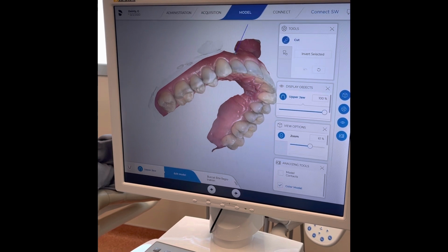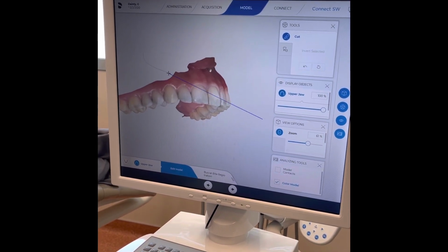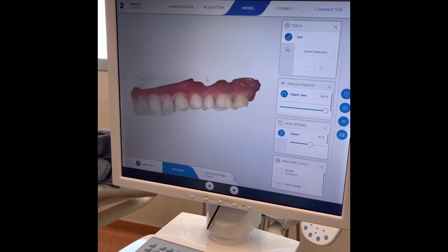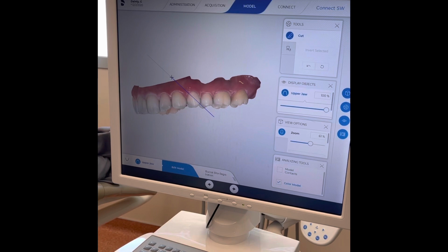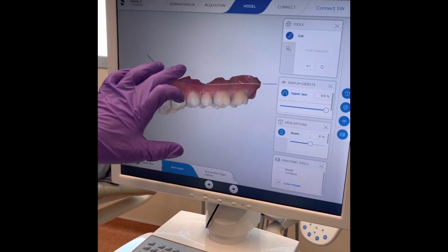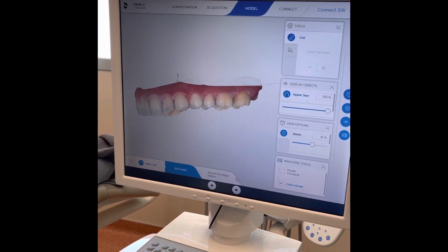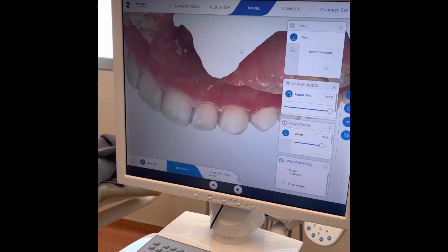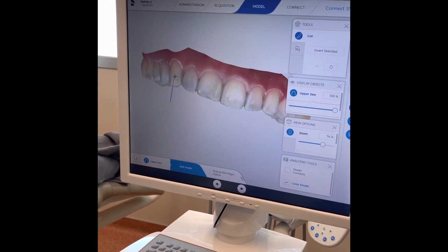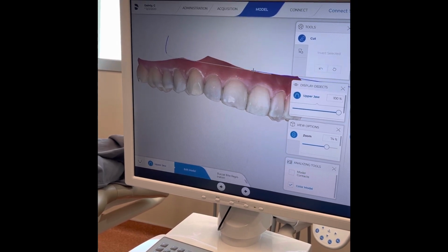And we'll go ahead and remove all of that tissue there. Same thing here, double left click to start, single left click to get all this out of the way. And what this is doing, anytime we try to flatten a model and we have less coronal apical position and mesial distal position along the bases of our mesh, there's less work that the computer has to do to fill in this mesh work in their digital planning software.